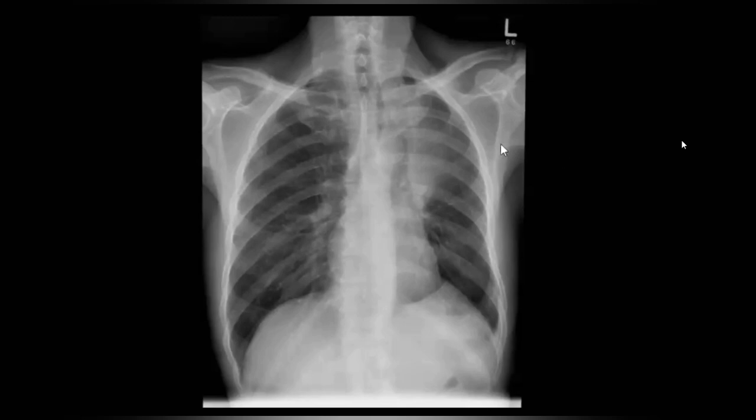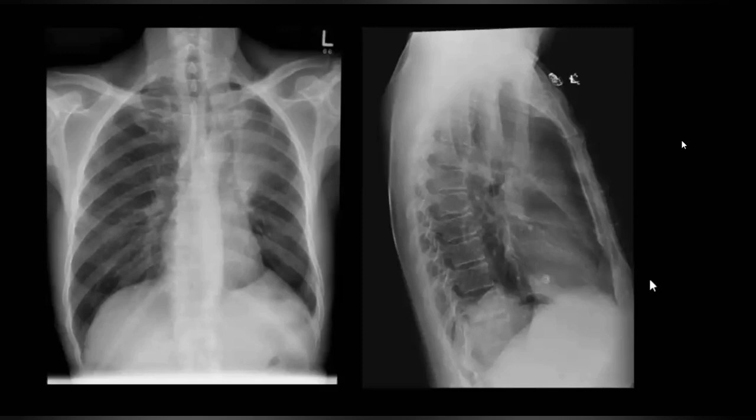Do you know why you see the lucency around the aorta? Because of its veil-like opacity, giving it a typical Luftsichel appearance. Do you know why you see the Luftsichel appearance? No, sir. You can tell me. Usually the superior segment of the left lower lobe will migrate and insinuate around the aorta. Yes, so the aorta doesn't touch the collapsed lung, so it's not silhouetted. So that's why.